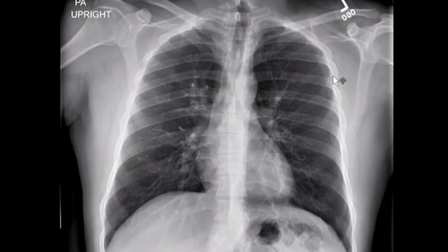Next, what I finally do, I look at the airways and the lungs. So what I do is I follow down my trachea onto the right mainstem bronchus, left mainstem bronchus, making sure there's no filling defect or mass within the trachea or foreign body which would be aspirated. I then take a look at my lungs. I get an overall feel for what the lungs look like, the right and the left. Then what I do is I compare each side in a zigzag sort of manner, and then I do the opposite zigzag on the way back, comparing right and left, right and left, right and left. Really paying attention to any opacity that will catch my eye.